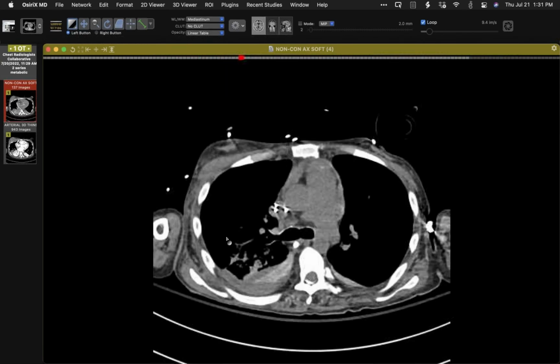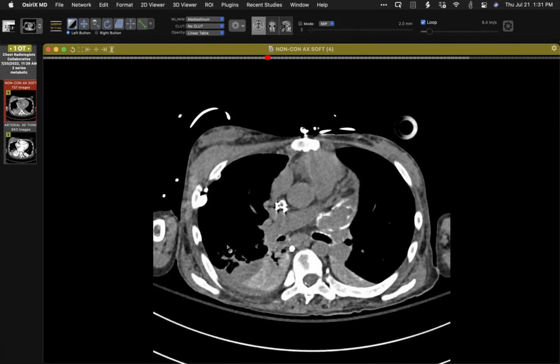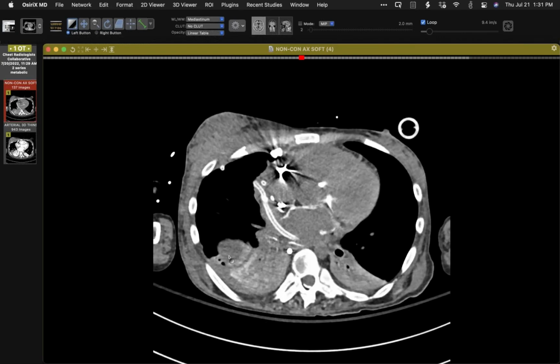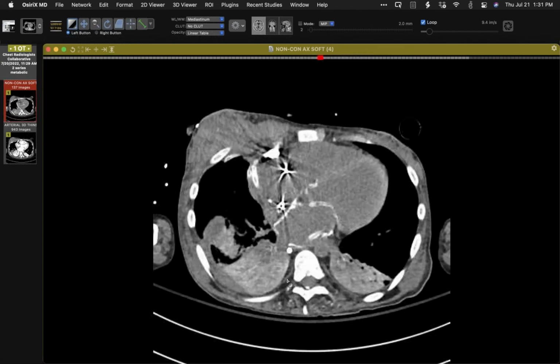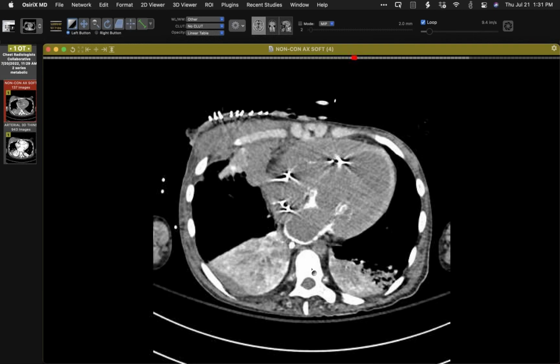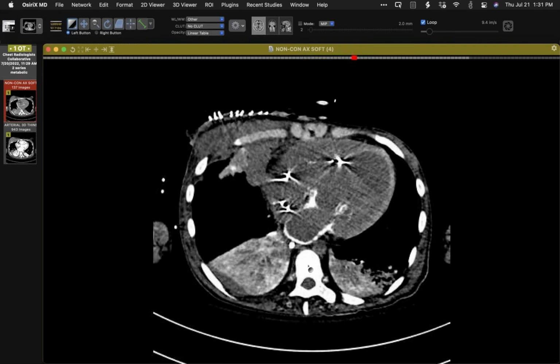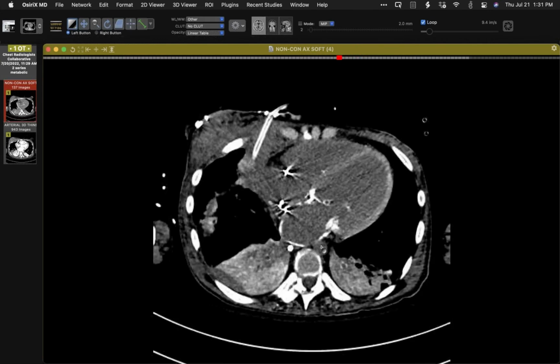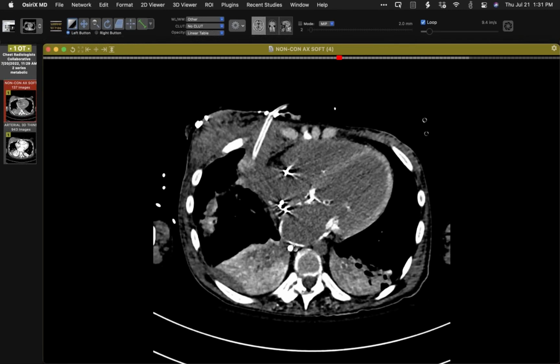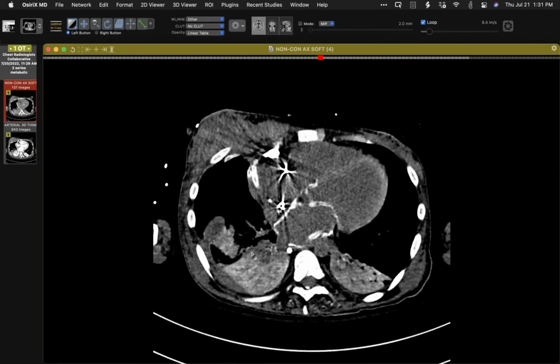And then go back to the mediastinal window and take a look at the amount of mural wall calcification in relation to the left atrium. And then I'll narrow the window width so that you can get a feel for how hyperattenuating myocardium is here compared to skeletal muscle and blood in the heart. So too much calcium.